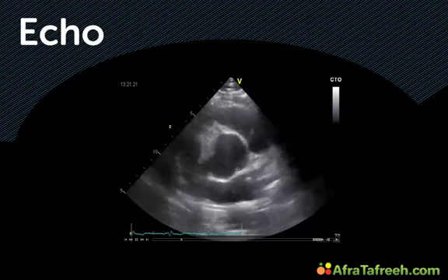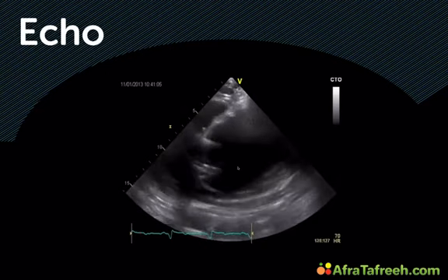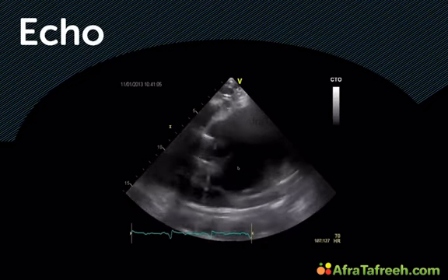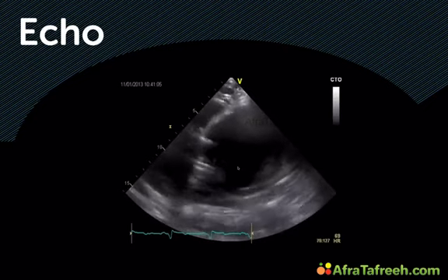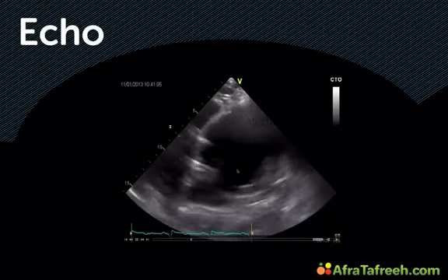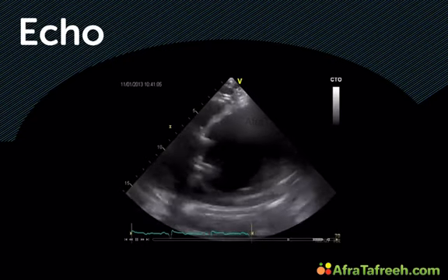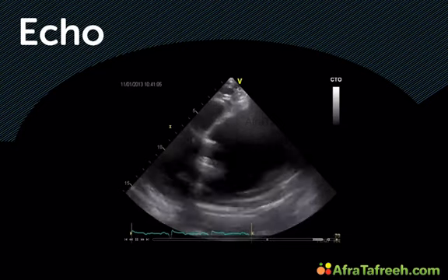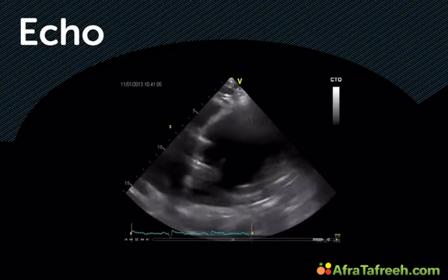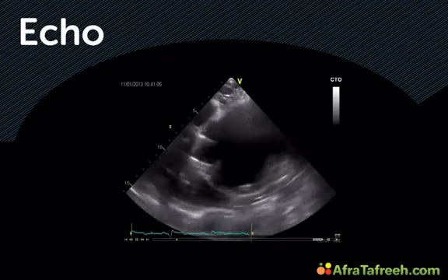And why is this so important? Well, let me just show you this patient here. This is a patient we saw just recently, just a few weeks ago. This is a patient who was operated for aortic regurgitation. He had a bicuspid valve, and here you see the mechanical valve implanted in the aorta. But what he also has is an aneurysm.